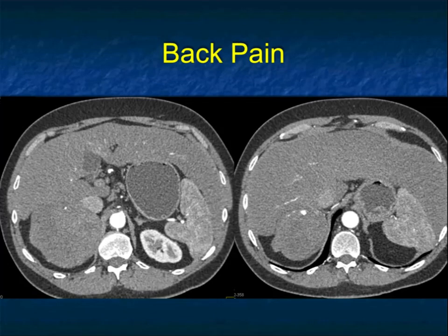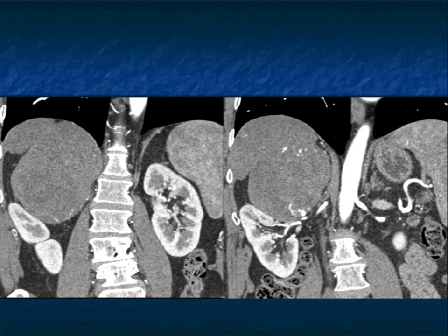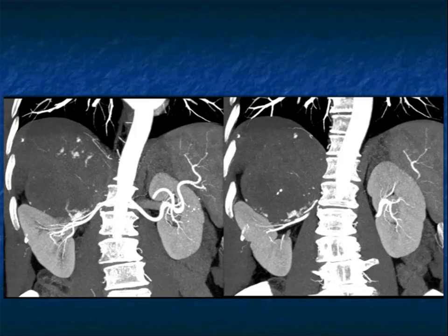Or in this case, look at this large lesion in the right adrenal. It looks solid. There's some rim enhancement to it. You have to worry, even though this lesion is homogeneous, could this be a primary adrenal carcinoma? It's a really large solid mass with areas of enhancement. Now, when I see puddling around the edge of the lesions, I could consider adrenal hemangioma. We've had several cases of that, but I think in this case, solid mass, you're still going to worry about carcinoma. There's no way you can call this a benign lesion. I would worry about malignancy.